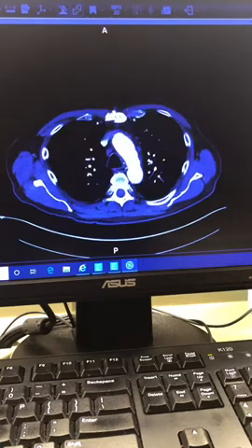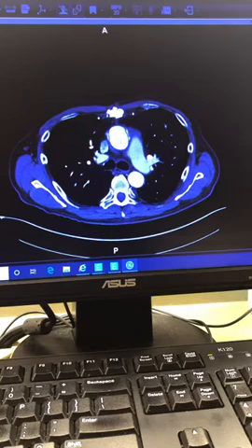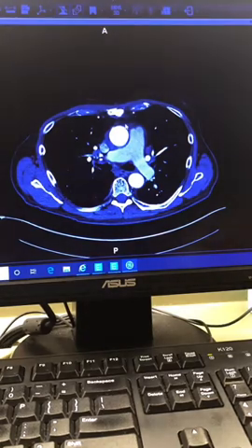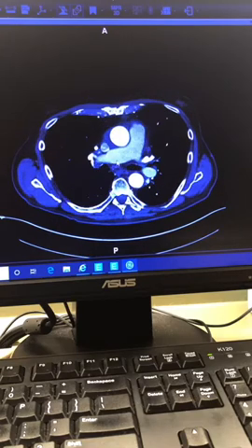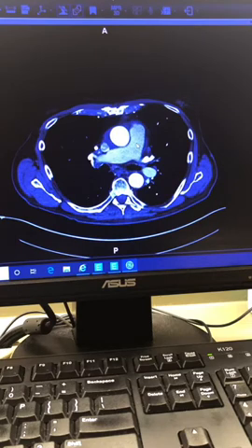So here it is. This is the angiogram of the chest. So we have our aorta, bright and beautiful. And this is what I was commenting on, the difference between this and a PE. Now, on the PE study, remember, we're focused on having the pulmonary arteries bright, right? But look how washed out these are. So we don't see these as pretty, and I think honestly for a PE to be diagnostic, the Hounsfield units need to be at least 400. I don't know what they are here, but anyway.